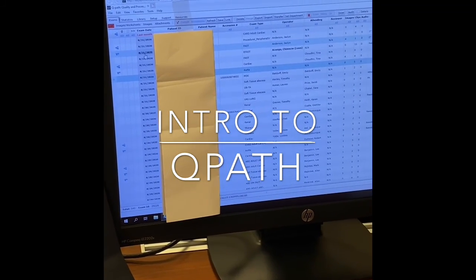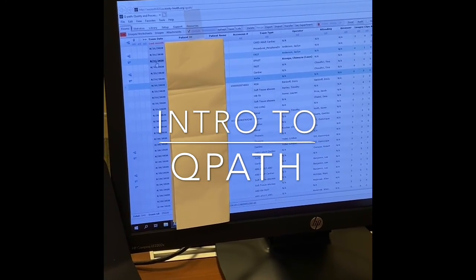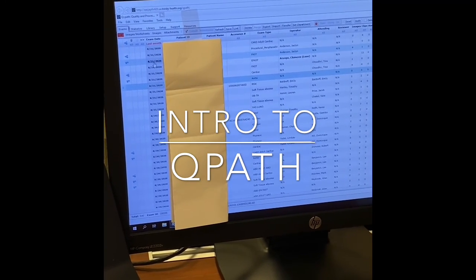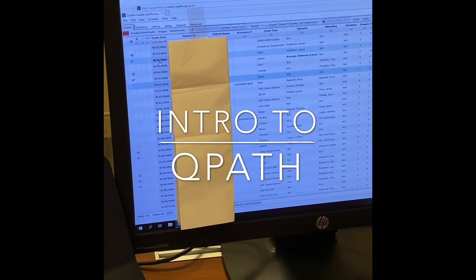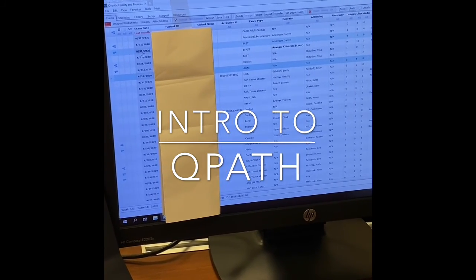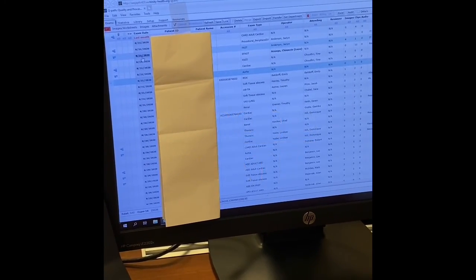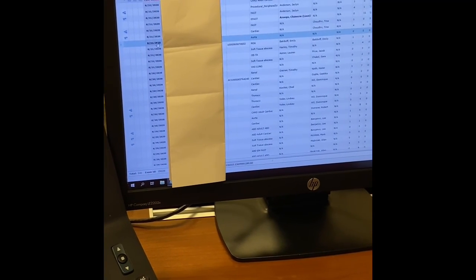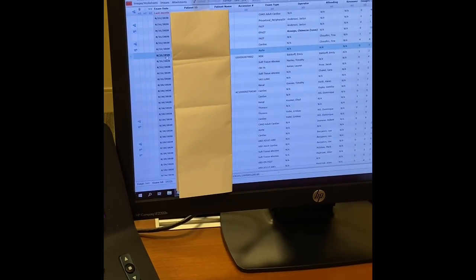And we could also see whether your interpretation of the images was the appropriate interpretation given confirmatory studies or given my review. It can also be helpful because I can give tips on how to better acquire the images based on the images that I'm seeing on the screen.